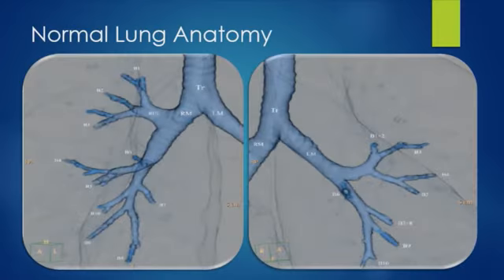Passing to the normal lung anatomy. Doctor, if you allow me, I will just explain on the images.